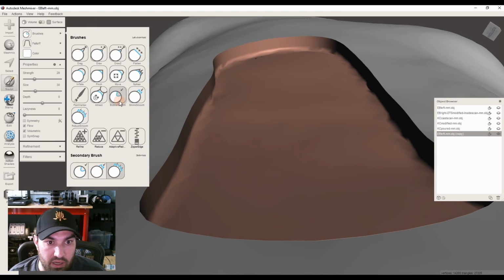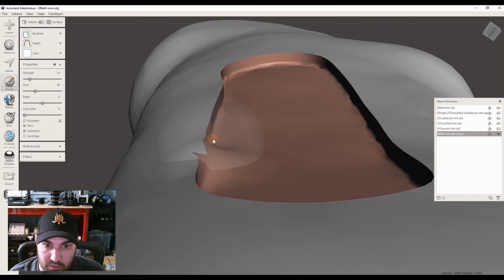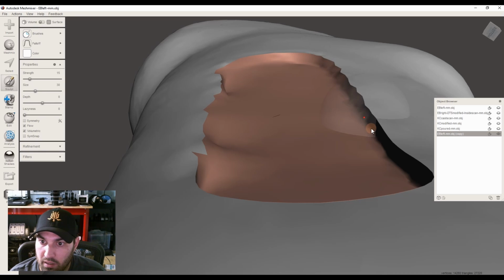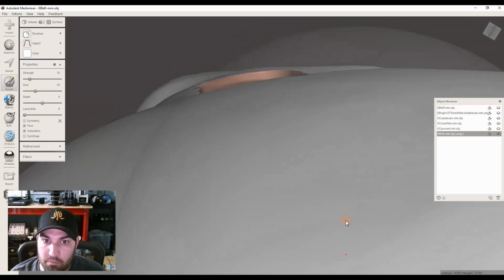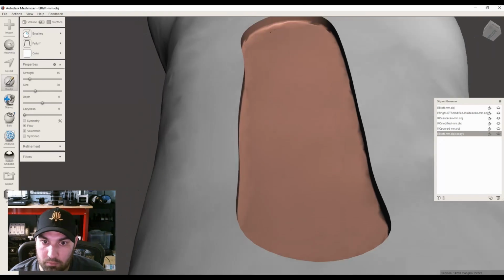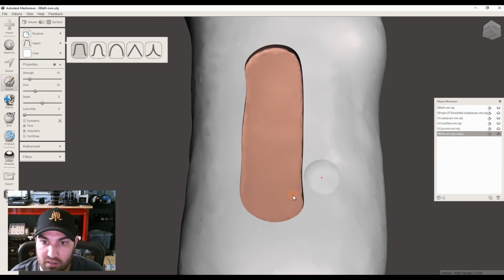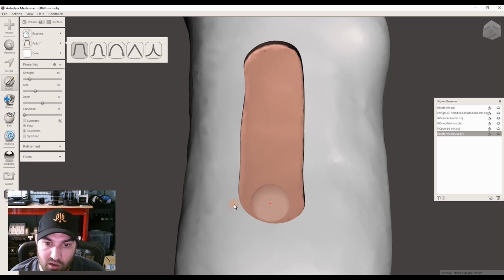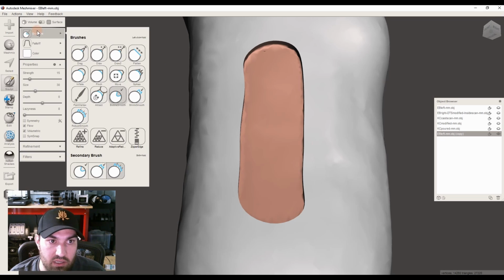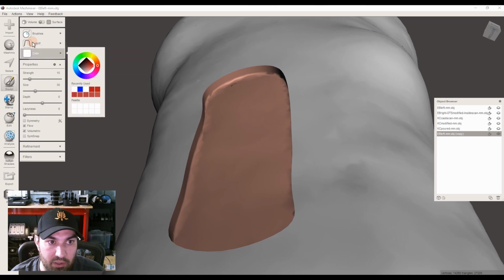So let's do a bubble smooth. You can see what this is going to do here. It's going to fill in that outer edge. And I just kind of use this as like a pre-smoothing sometimes instead of just trying to select it all. If I find that selecting it all and doing a quick deform smooth isn't giving me the result I want, sometimes I'll do a little bit of a sculpting smooth first just to make it work better.